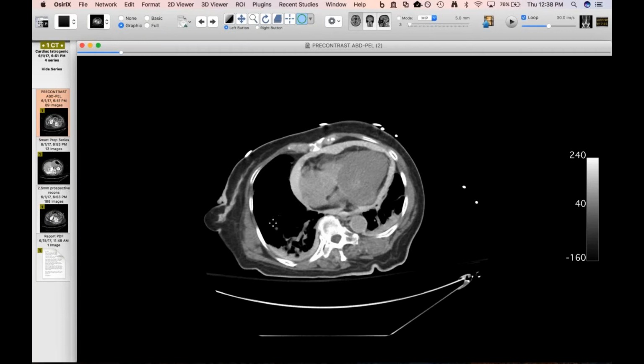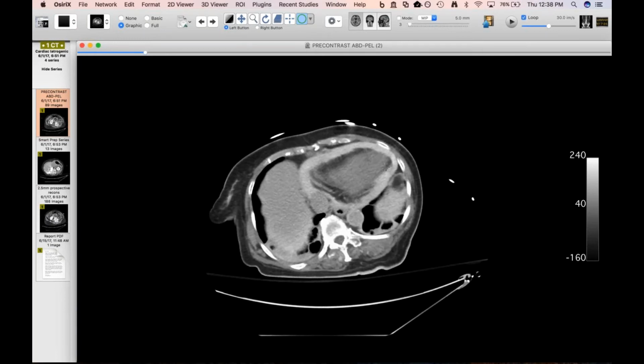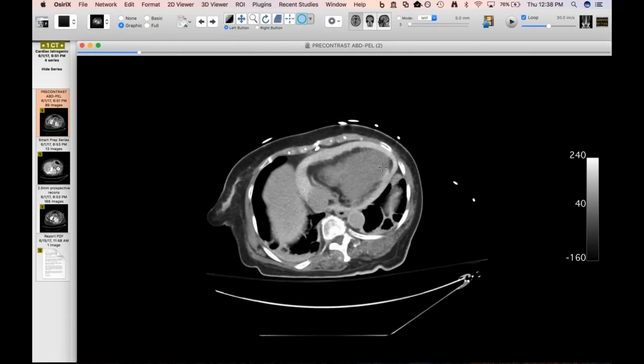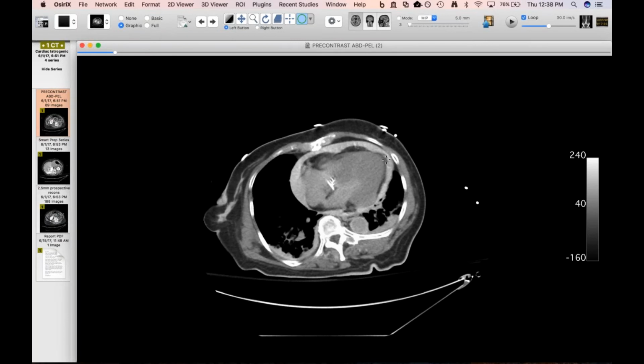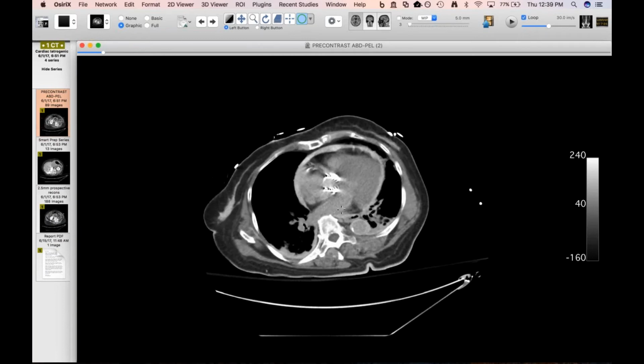And that's from an arterial puncture then. It's retrograde in the aorta that they go back. Yep. If they're doing this transfemoral, then it'll be a femoral catheter. This one was transfemoral. That's a good point, because they do these transapical in some cases, where you actually go in through the apex of the left ventricle. That was not the case here, but that would be another reason to have hemopericardium. So I don't know.